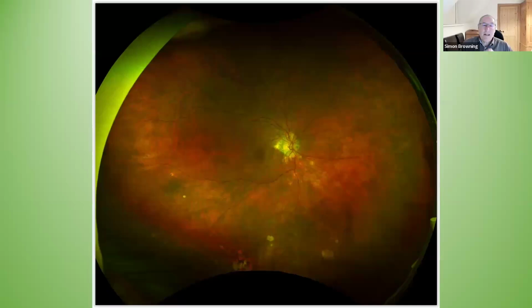And they actually asked the Optos team there if they could blur the images because they really couldn't understand what was going on because the image of the retina was far too clear, which I've never forgotten, because here we are all craving for clear images and they were moaning that the images were too clear.